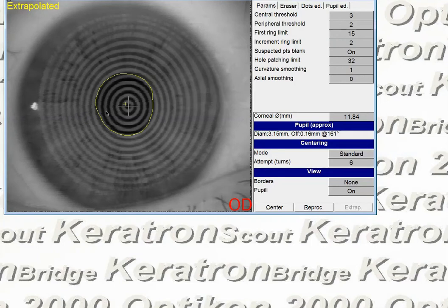You'll have two versions of the patient, one called original or unedited, and the second one you can name edited and make additional changes. That's optional, just in case you want to have a record or reference of what you originally started working on.